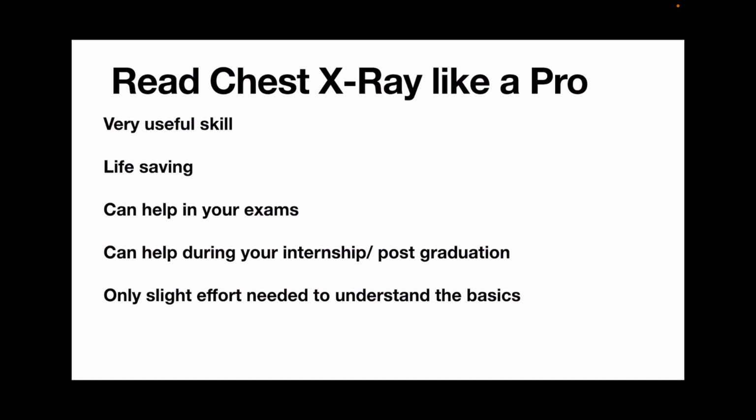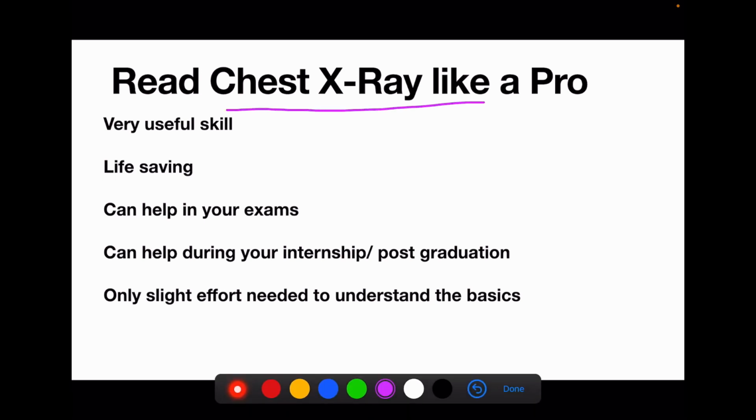So in this video, I'm going to be teaching you how to read the chest x-ray like a pro. As you all know, reading the chest x-ray can be a very useful skill, and it can be life-saving. For example, if you're able to detect a pneumothorax or a small lesion which could potentially be malignant, it could turn out to be life-saving.